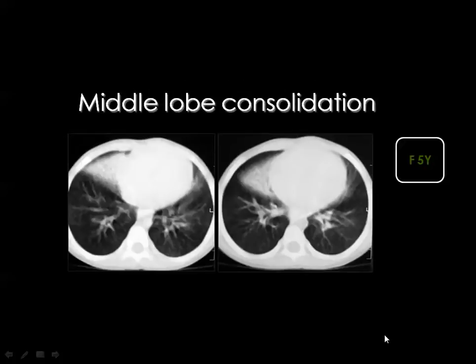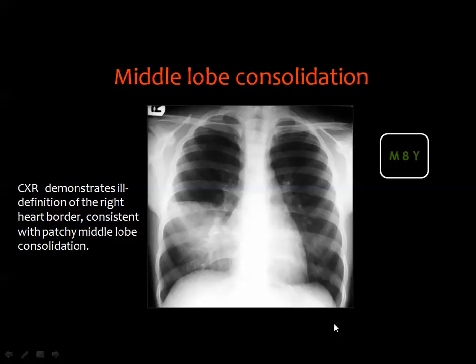the lesion. Then usually you do not need the help of CT to diagnose pneumonia, since the clinical manifestations are evident and also the X-ray findings are enough for the diagnosis. But whenever you have a CT scan for a pneumonic consolidation, you can see this is an example of consolidation in the middle lobe with faint air bronchogram inside.